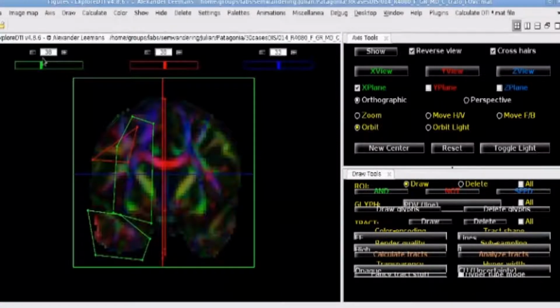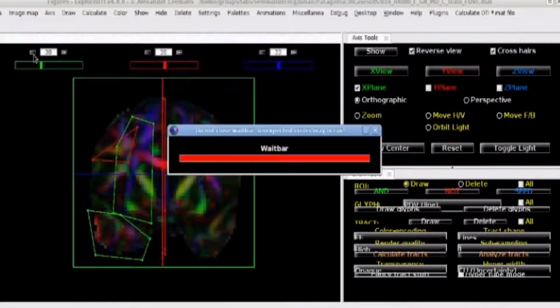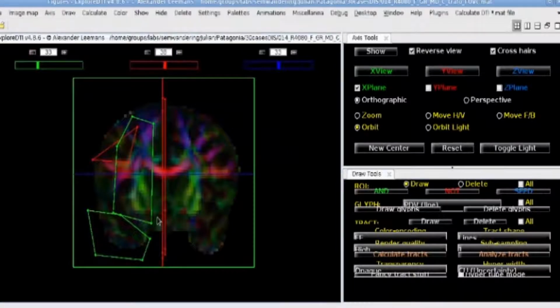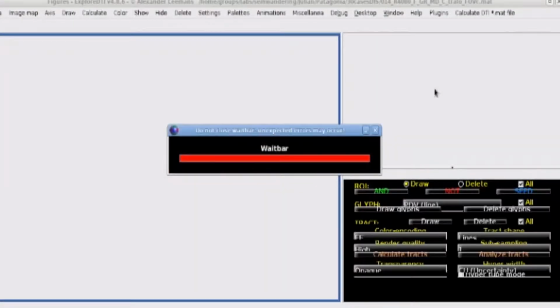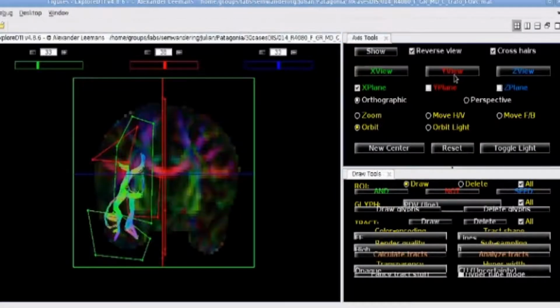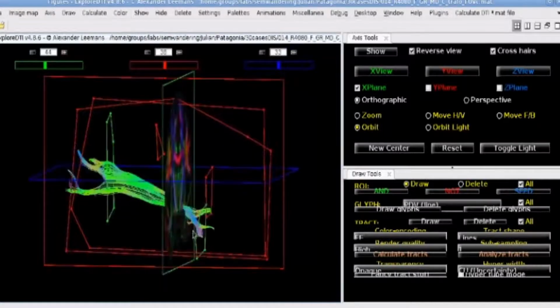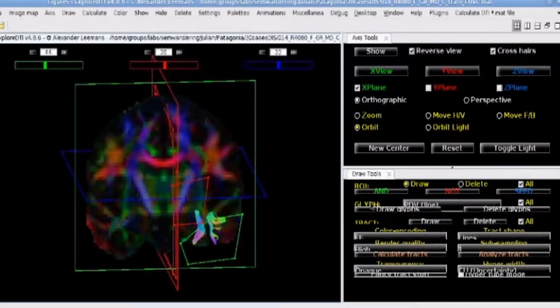You need to capture both hemispheres, locating a not region of interest in the center. We use a technique that is expert segmentation.